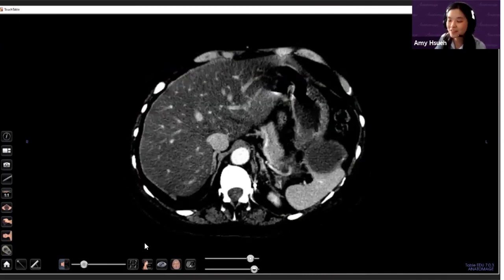So you can ask them questions like that, walk them through it, and then have them take the pictures, take the screenshots, mark it down, and present that, turn that in. So you find the liver, you go, okay, this liver looks really weird. And then you can move on to the next thing that the radiologist found, which is the splenic cyst.